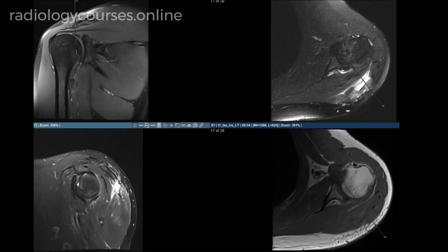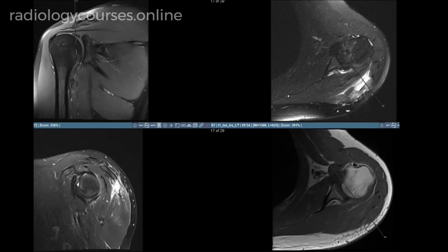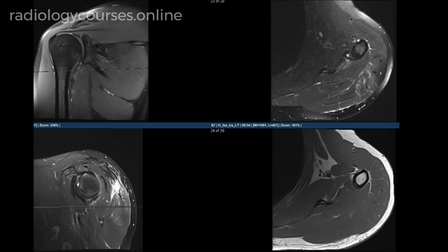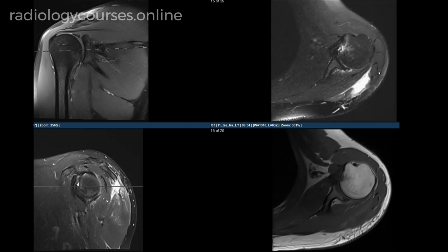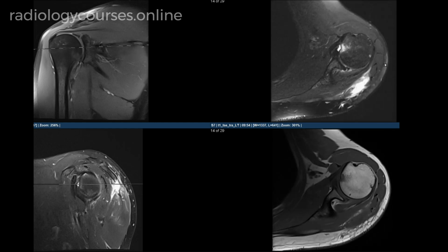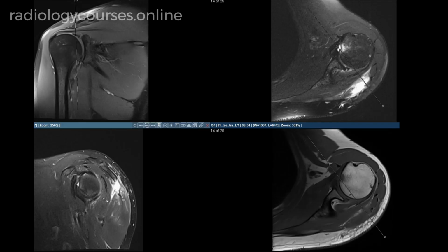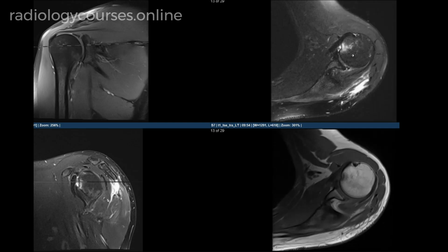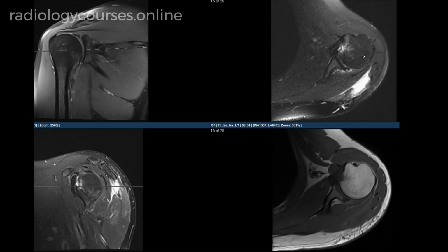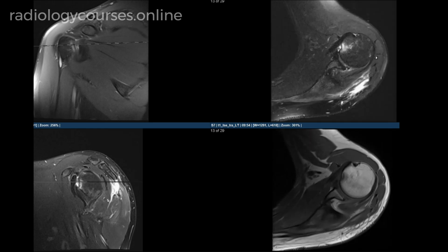The important thing to remember in reporting in radiology is, once you document the abnormality which is visible to anyone's eyes, you need to make sure you're not ignoring the other findings. So, the second abnormality which catches our eye is here in the anterior aspect of the humeral head. So, what is this abnormality? How do you describe it and how to infer?